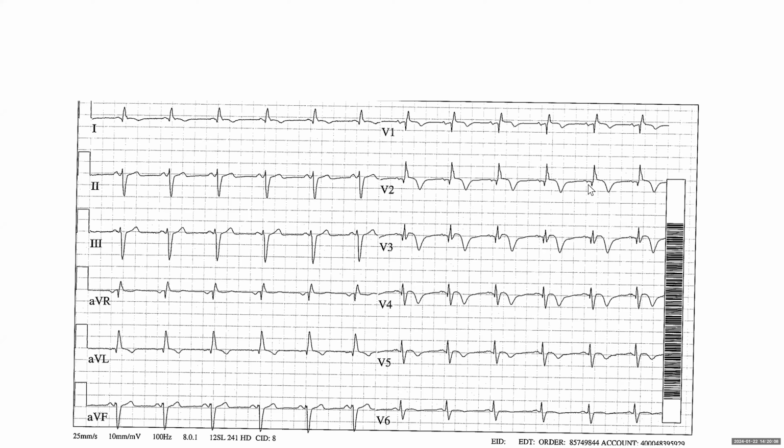Okay, and what's unique about this right bundle branch block? If you were to describe the waves in V1, is it RSR or QR? Excellent, the ischemic right bundle. Yeah, exactly, so this is QR. Good, QR, exactly. So this QR is ischemic right bundle. It means you lost septal branches that supply the right bundle, and the right bundle block is due to ischemia. It's not the usual conduction disease right bundle. Good. Was there another question?